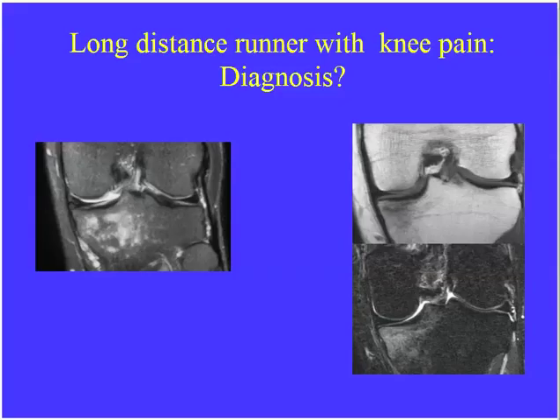Okay, we're going to talk just a minute about stress fractures of the tibia. Another common question is to show stress fractures of the tibia in various forms. These typically occur in runners or in people who increase their level of training or change their type of training. You may just see some marrow edema initially, but over time you'll start to see an area of linear signal abnormality that again runs perpendicular to the normal trabecular pattern.